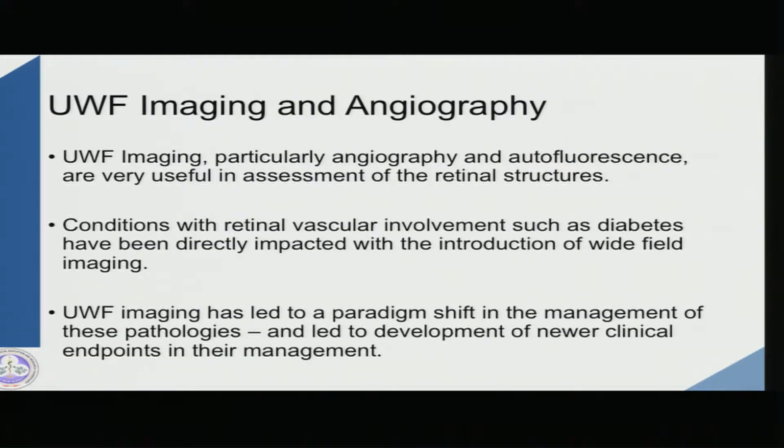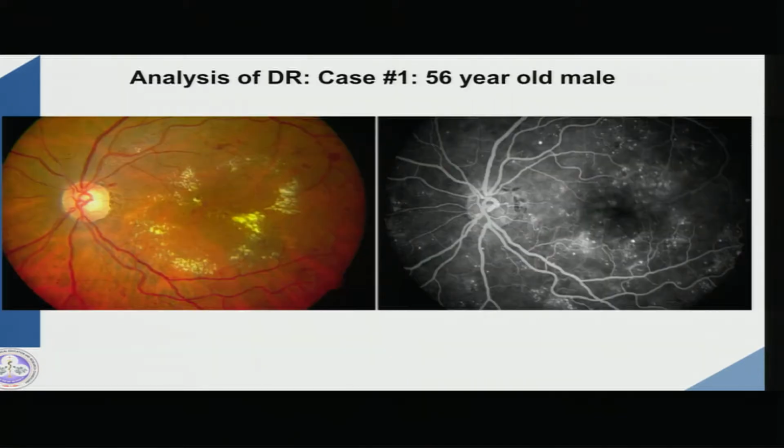Ultra-wide field imaging, particularly angiography and autofluorescence, are very useful in assessment of the retinal structures. Especially conditions with retinal vascular involvement, like diabetes and occlusive vasculitis, have been directly and significantly impacted with the introduction of wide field imaging.